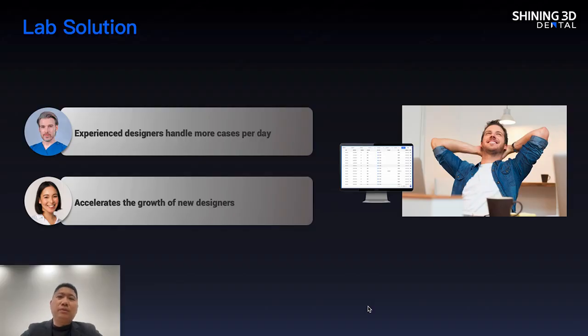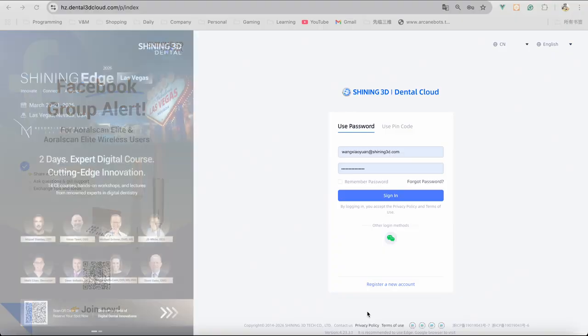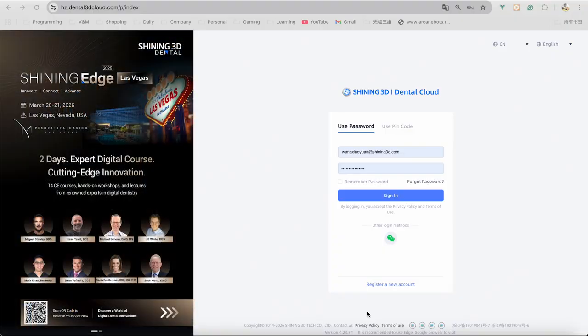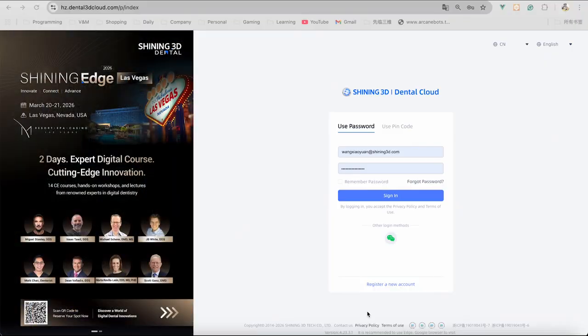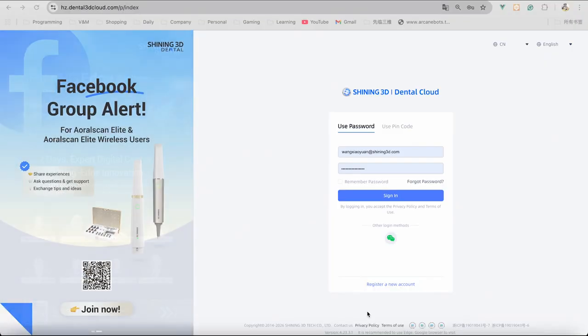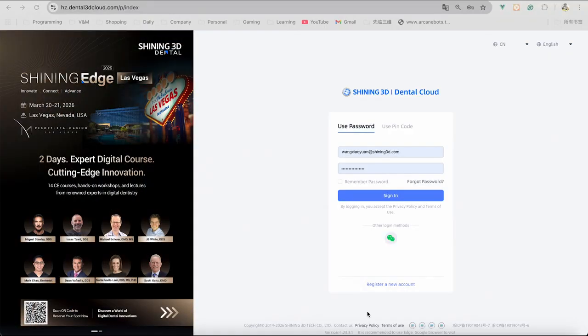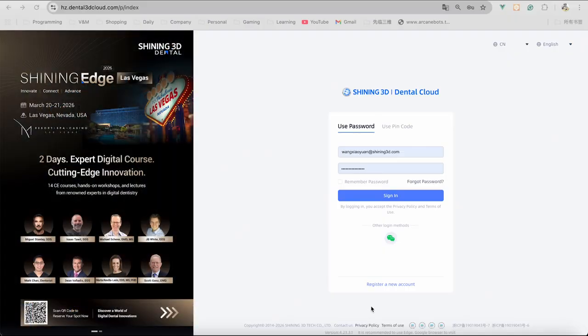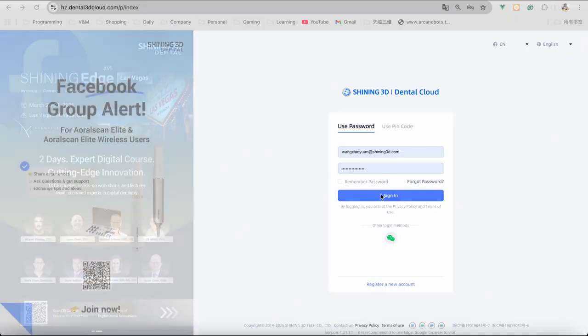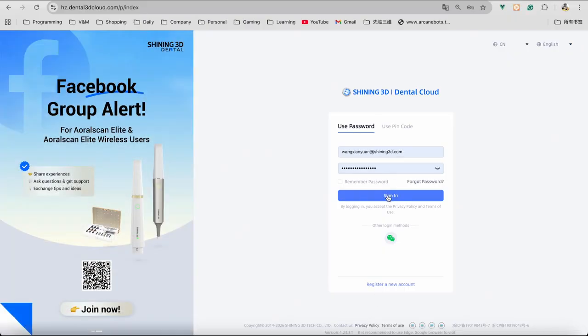With all those concepts, now I'm going to have an online demonstration for you. Let's go. First, visit dental3dcloud.com to access our website. Before logging in, you need to have an account. If you don't have one yet, please register one. Our platform is open to everyone. After you get an account, then we're going to sign in.